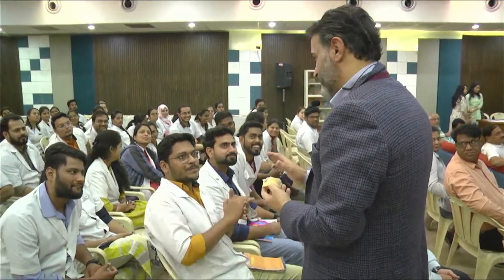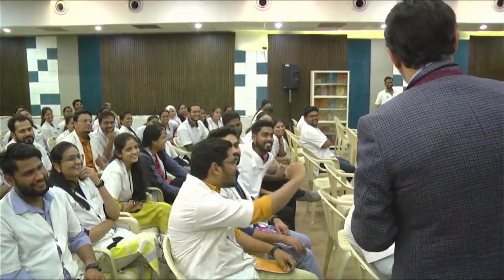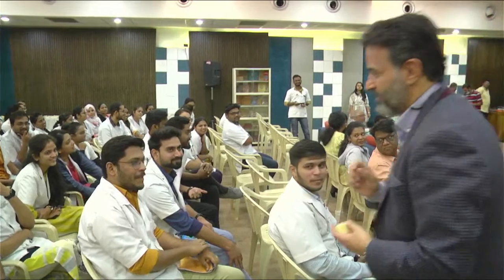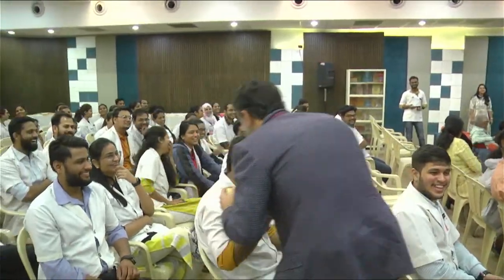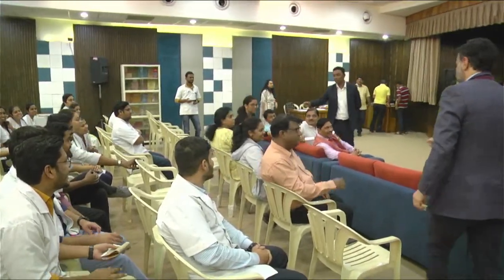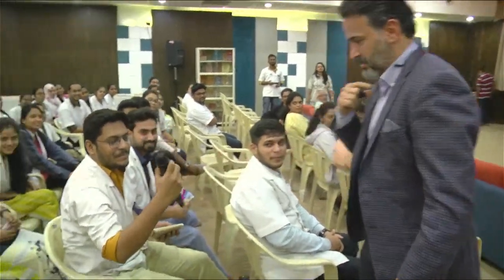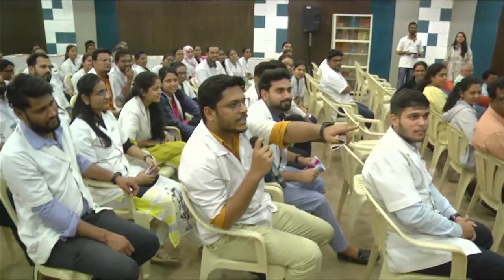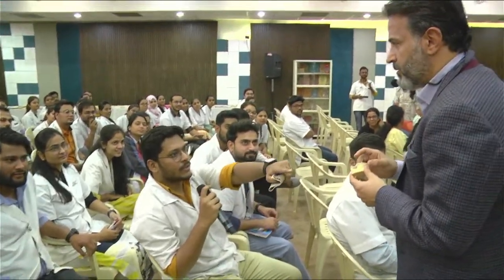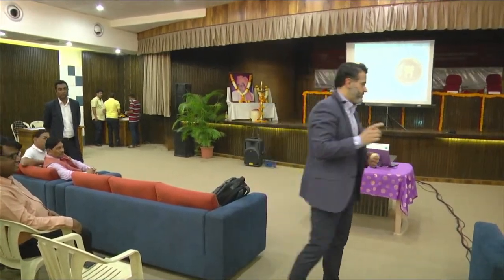Yes, but please open, okay? Don't close, okay? One question, the microphone, please. You can talk like this. Sorry, doctor. The drilling size which is given in that is for the final drill. So that size which is there. No, you failed. It's for the pilot drill. We have a tube system. Okay, and look, it's very good. Thank you for asking it. But let me show you.